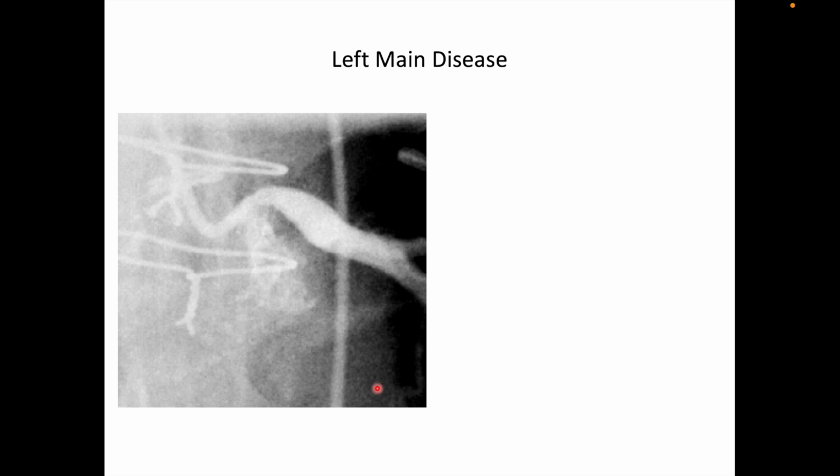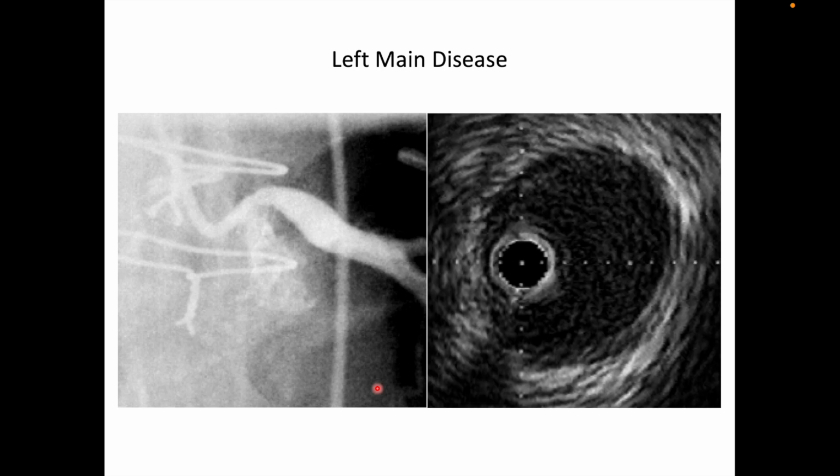So this time somebody decided to do an IVUS for this patient, and on IVUS the MLA of the left main stem was 11.9 millimeter square. There was no significant disease in the left main stem, and that's why the grafts did not work. It was just the angle of takeoff of the left main that gave the false impression, and superadded spasm that it gave the impression of ostial critical left main stem disease. So twice the patient underwent CABG.